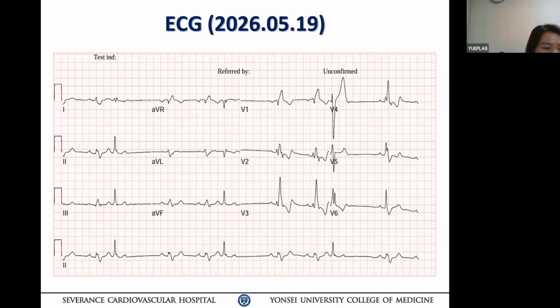Not sure. Okay, Theo. Is it normal to have such an extensive right bundle branch block pattern all the way to V4? Yeah, it's not typical. Somebody should say. Okay. This is abnormal, right? Yeah. So that may lead to your diagnosis of why some patients have such extensive right bundle branch block manifestation. That's something you need to think about in the first diagnosis. That may lead to why your narrow complex is happening. Okay, think about that a little bit. Theo, please answer Dr. Huang's points.